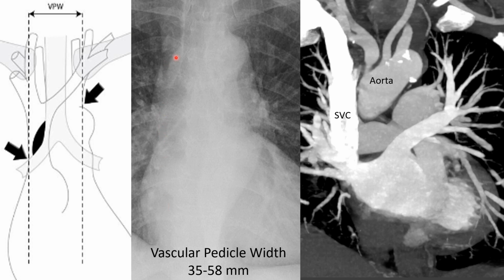So we want to draw a line through that. So let's do that. So that's where it intersects the bronchus intermedius. We drop a line down. So that's going to be the right edge.